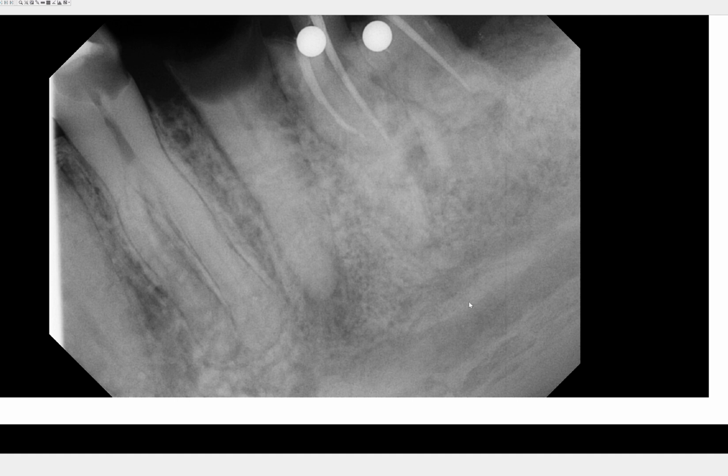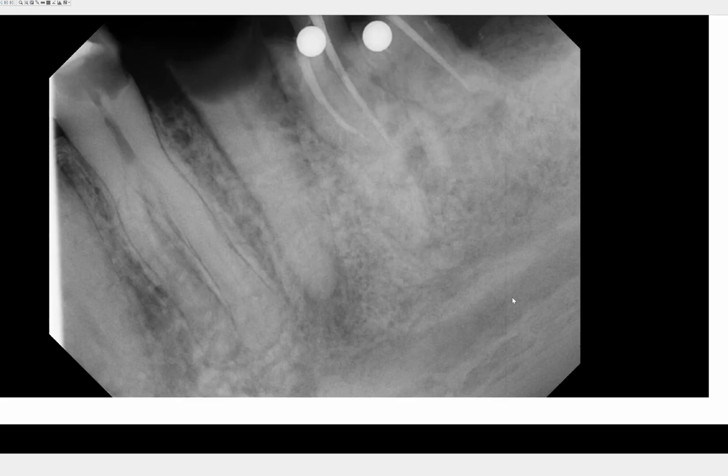So I think most of you would probably choose this as the mandibular canal, and I would agree with you. Let's see if I can pull up another radiograph. Well, this is not a very good one with a large cone cut, but again, the point is how many canals do you see, or is there any sign of normal variation in the size and shape in the course of this mandibular canal. And your answer should be, we can't tell for sure, it's uncertain. I think that's how I would assess, right? For the most part, it looks normal to me.